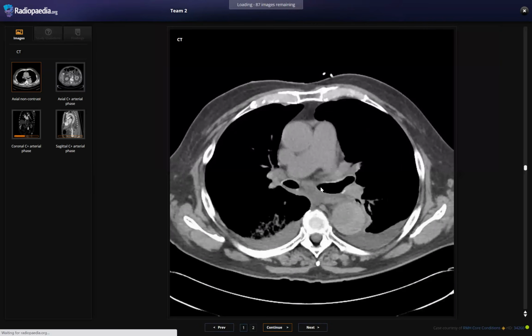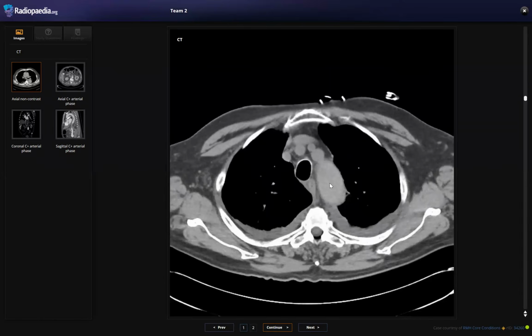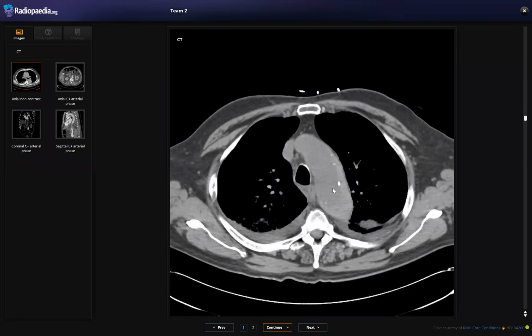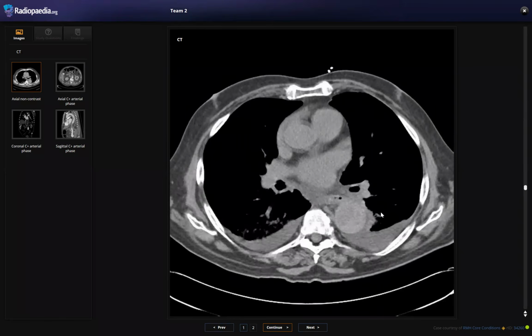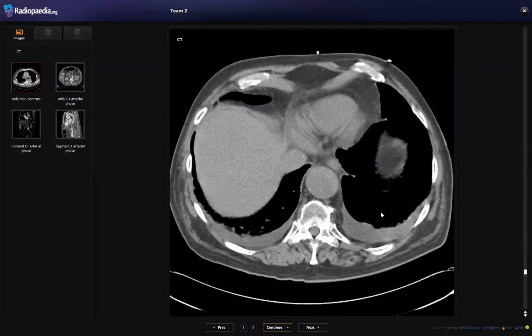Okay. You still have the control. Okay, so I'm just going through the images. These are non-contrast images of the CT thorax. So this is showing evidence of intramural hematoma. I can see there is mural thickening involving the aortic arch with the displacement of the intimal calcification inward, and it is showing extension into the descending thoracic aorta and also involving the abdominal aorta as well.